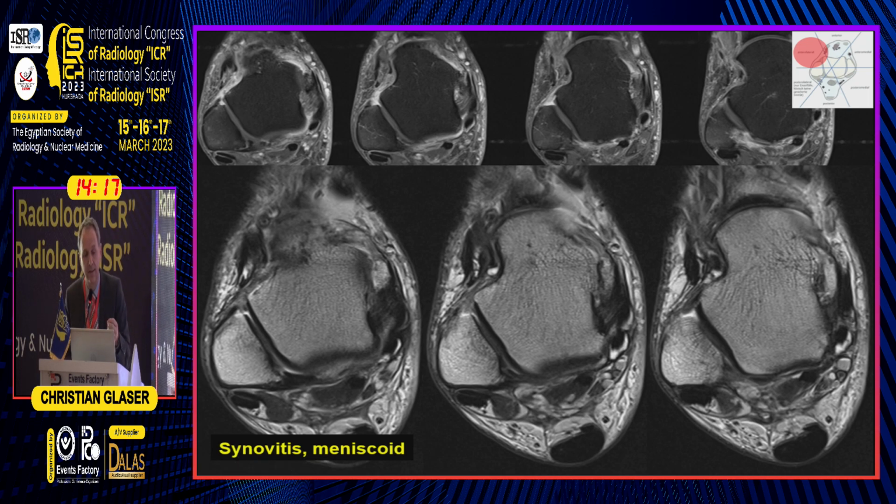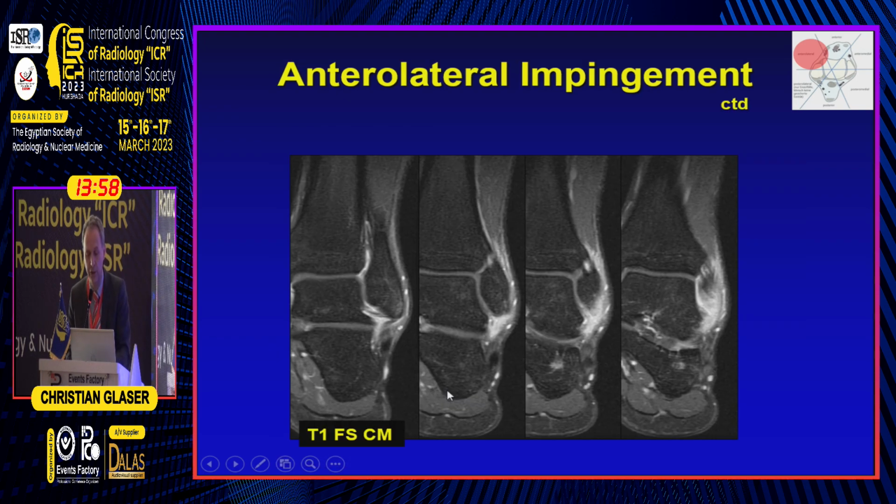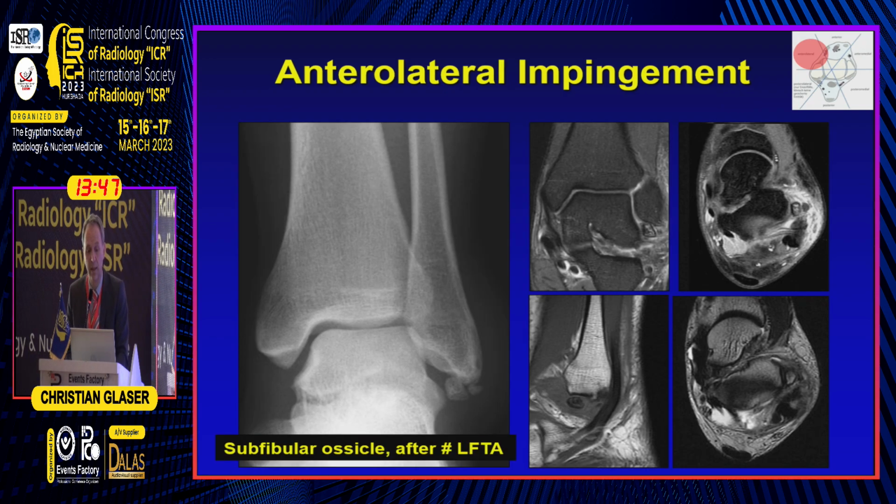In these cases, we'll highlight the inflammatory reaction, even if it's comparatively subtle. And this is what you may encounter in this location. You may have but subtle changes, but the patient has the clinical diagnosis of impingement. This is different from that case where you do see prominent inflammatory change that can be easily appreciated either in the axials or in the coronals by the inflammatory reaction in the corresponding region.